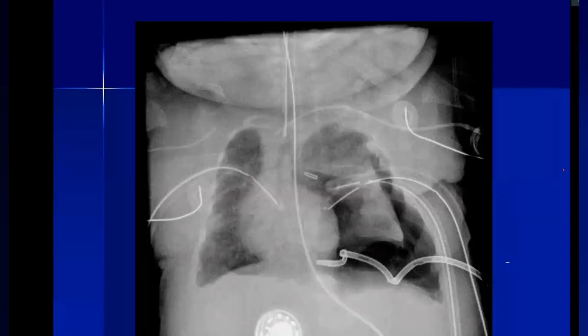And again, this is another patient with barotrauma, chronically ill, lungs are sick because of hyaline membrane disease. We ended up putting a pigtail drainage catheter to relieve the subpulmonic left pneumothorax, as you can see, despite the presence of 2 left side chest tubes, but the left pneumothorax was not resolved. So we ended up putting a pigtail drainage catheter here.